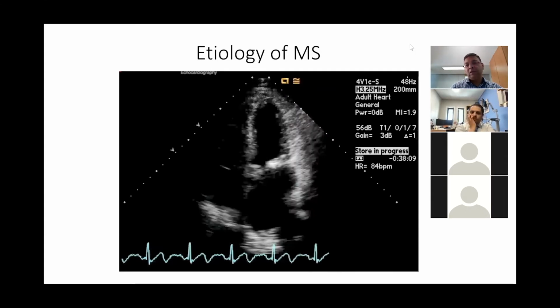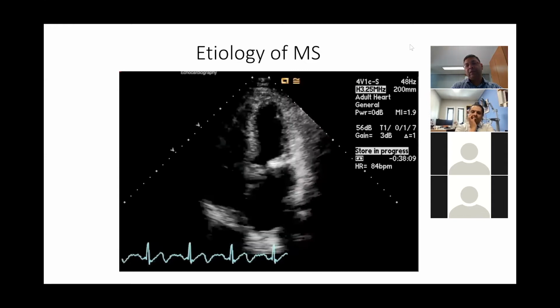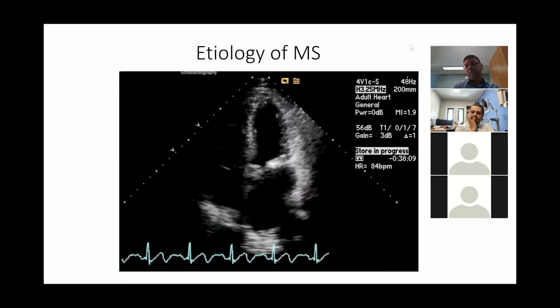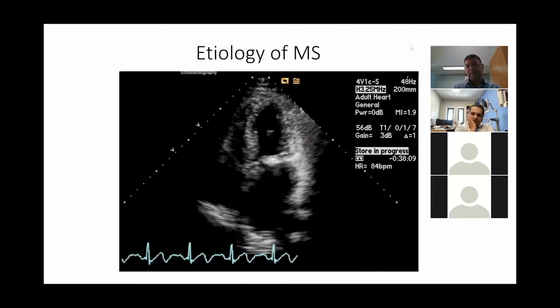It was rheumatic in origin, so you can see the tip is also affected. It's not only the base. And there is superimposed calcification on the rheumatic valve.